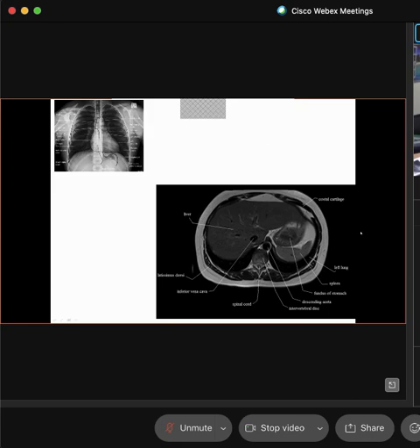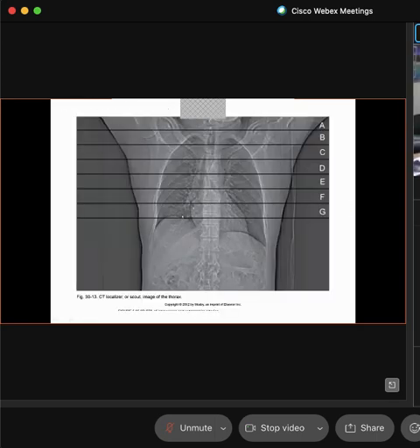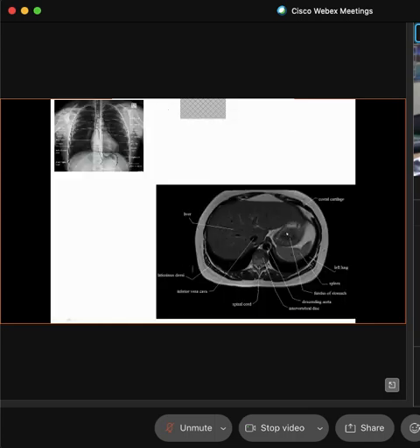Duane, what is it? The axial slice. It is an axial slice. So we have just a segment. So what we did, Daniel, is we sliced this patient this way. Patient was like this, and we sliced them axially or horizontally. And so what we did is we separated all the other sections.